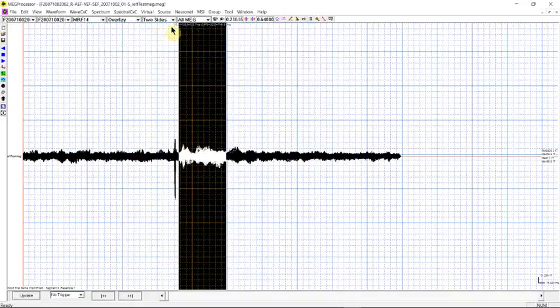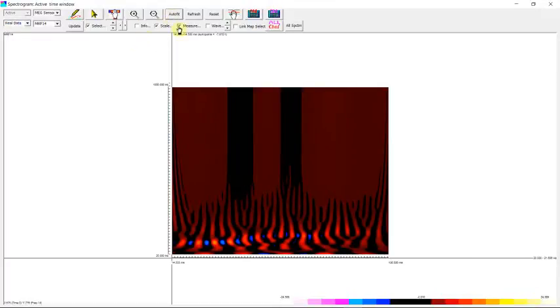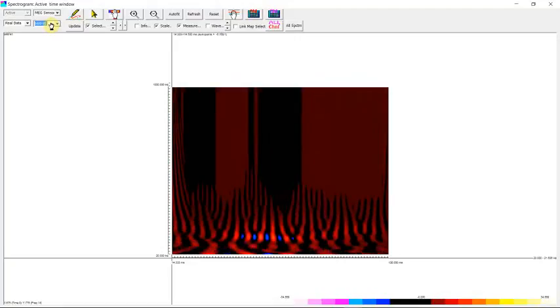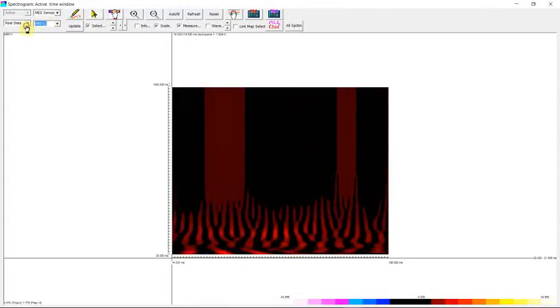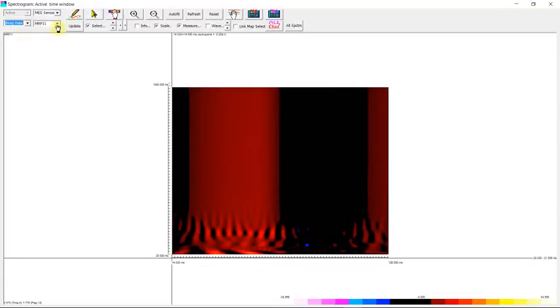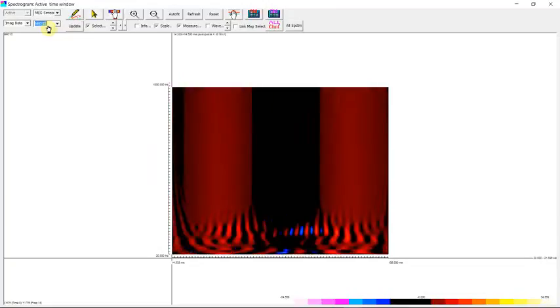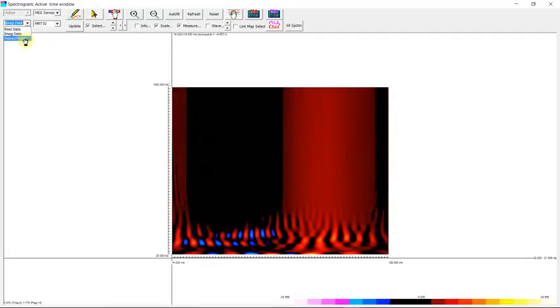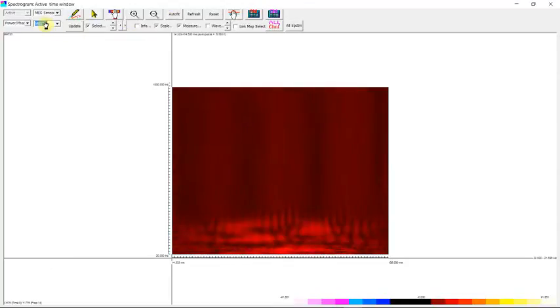And we can also see single trials. As you can see, this is one channel. And we can look through all of them, for example, by using the arrow key, move up and down to see the frequency changes of the real data. And we can use the imaging data. This right side. We can see the power. And also we can go through each channel to see how the spectrum changes.